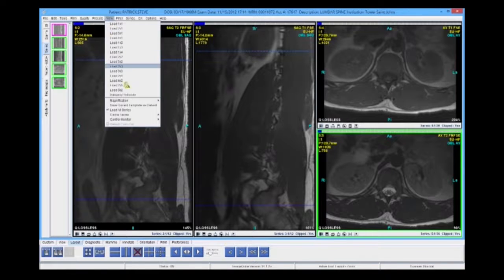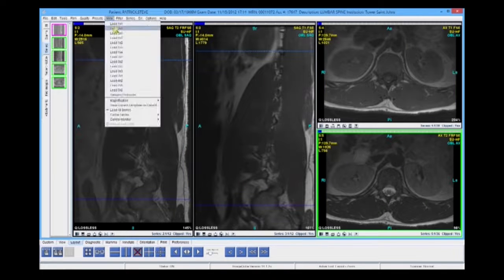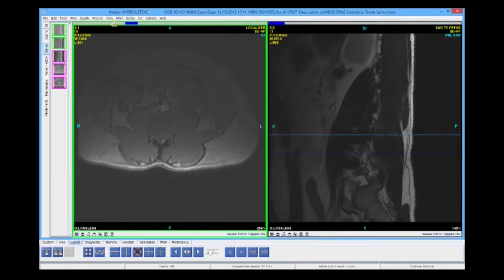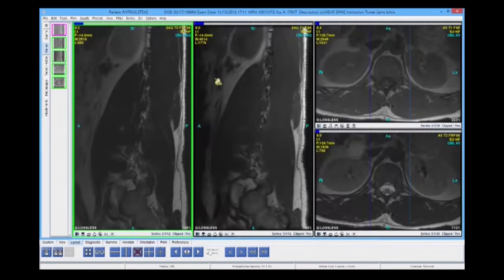User may give that custom hanging protocol a name. Save it either as their user settings, server-wide, or just locally. That protocol may go between a standard grid, and when the user selects that custom hanging protocol, it's immediately applied.